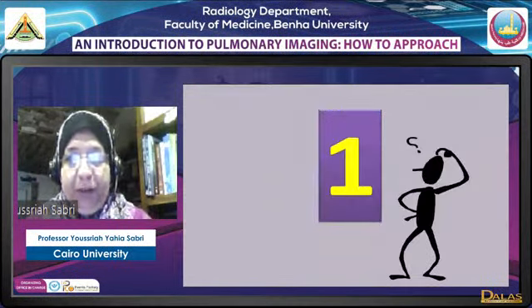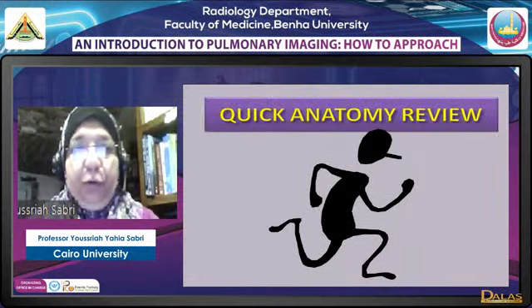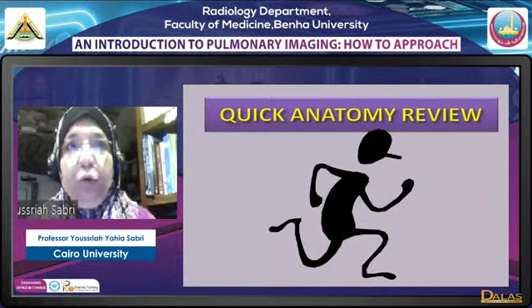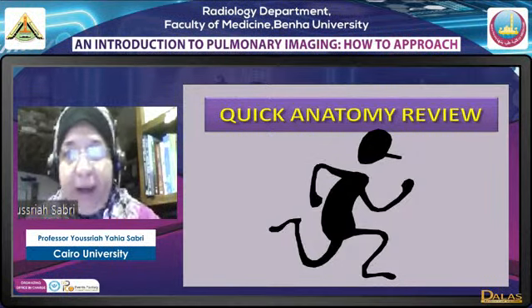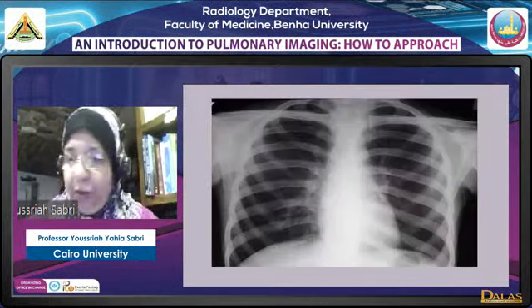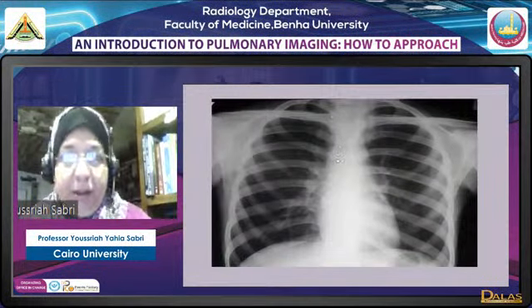Now to start with, we're going to go through a quick anatomy review. Anatomy is a main tool for the radiologist. It's not something you just memorize, take the exam on and finish; it's one of the main tools. To start, we have this chest X-ray PA view.